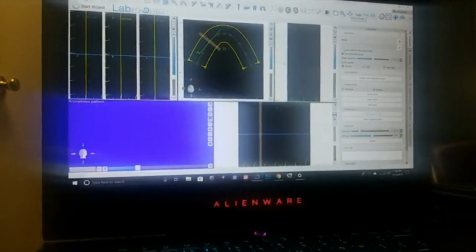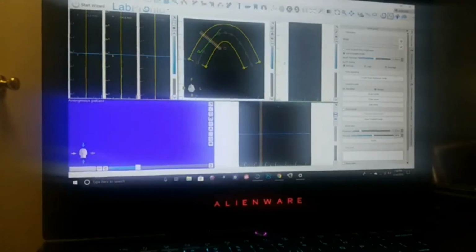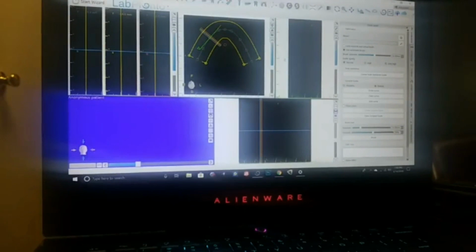So I have a couple of CT scans that I put away specifically for this online live broadcast, just for you to go ahead and look. The purpose of this live broadcast is to teach you a little bit of the basics about understanding CT scans, be able to see the images and look at them in a different way, and to understand what you can see.